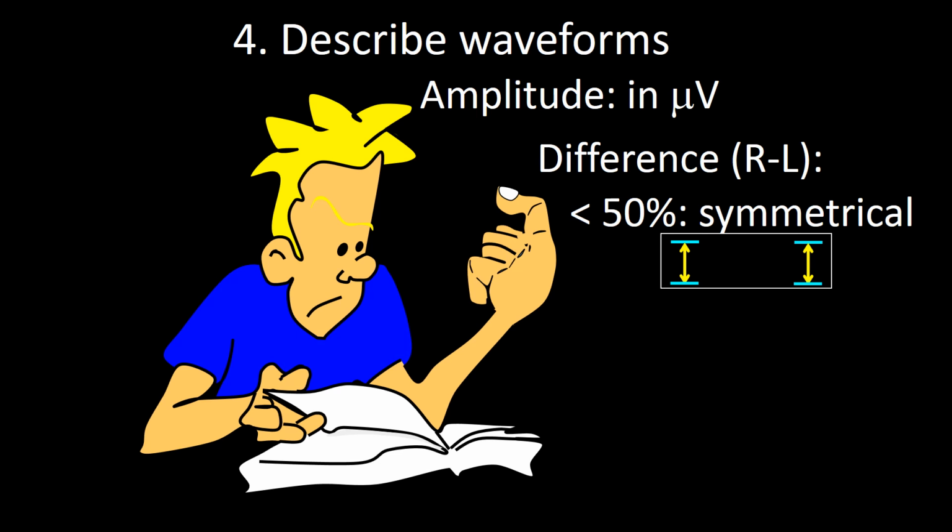The reason for this is that when an asymmetry is only 50% or less, the likelihood of demonstrating an anatomical pathology is very low. In this frame, I have represented an asymmetry of less than 50% as the presence of no asymmetry at all, and made it as two lines separated by the same distance between them.